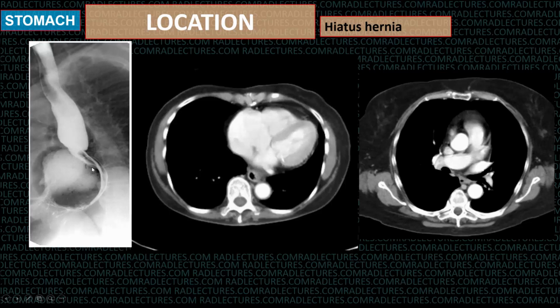Now, if the gastroesophageal junction has gone up through the hiatus, then it is called a sliding or type 1 hernia. This is a very common hernia, and sometimes they can be very small and sometimes they are large like this. A lot of times these hernias will occur only when the patient is lying down in the supine and prone positions. When you make them stand up, they will go back into the abdomen. In those kinds of hernias, you know that the esophagus has not become shortened.